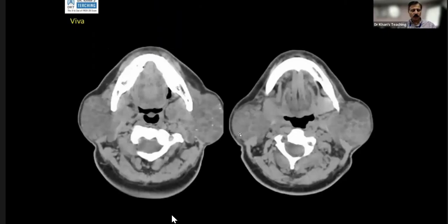Okay, over to you. What is happening here? I'm provided with a CT image. What I can see is that the bilateral parotid glands are swollen with multiple hypodense lesions within, likely representing an autoimmune process that is involving the bilateral parotid glands. So I would like to correlate with the history of the patient.